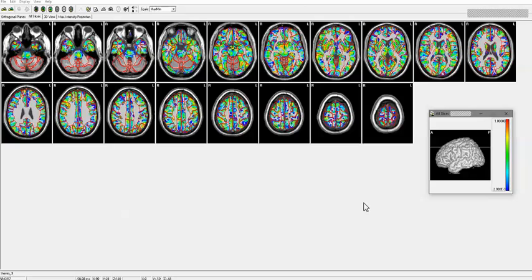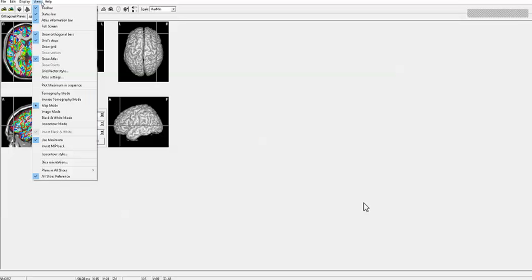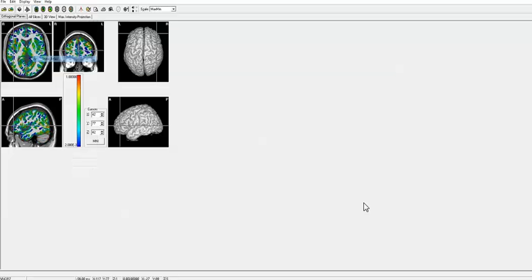There's over 4,000 voxels in this view. It's over twice the number of voxels that are in the Key Institute LORETA. This case is an swLORETA solution mathematically, but it's weighted by virtue of weighting towards the sources that are deeper get higher weightings. So there's a lot of different ways to look at these inverse solutions. You can color them in a different way.